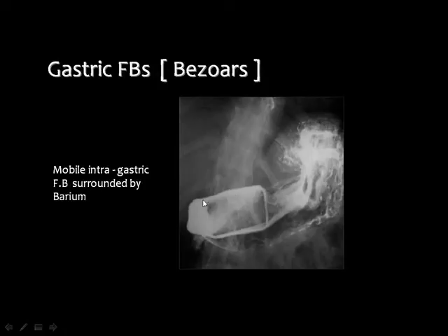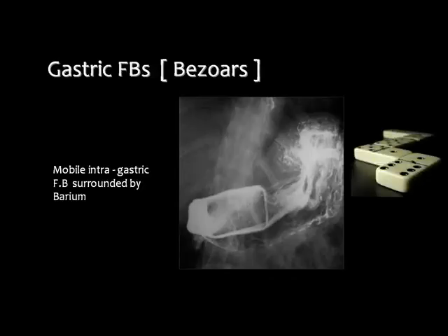And this is an example of a foreign body in the stomach. Can you predict the nature of this foreign body? Okay, this is the foreign body.